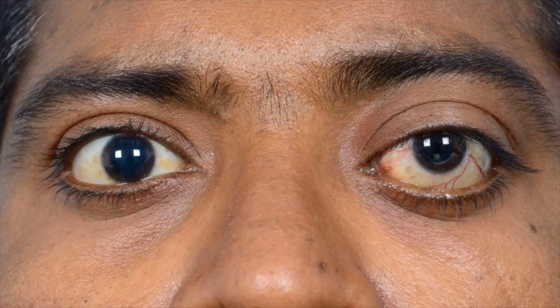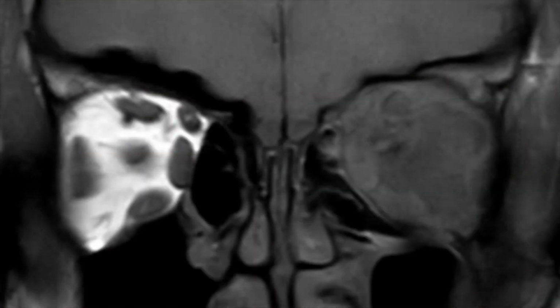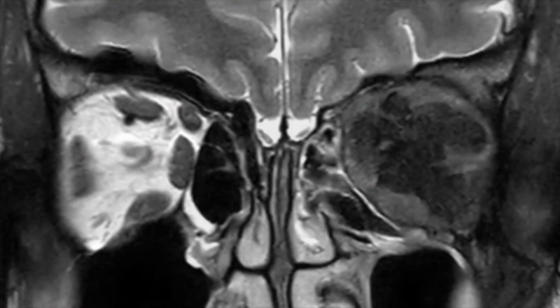Here is a 34-year-old male with only light perception in the left eye, axial proptosis, restriction of ocular movements in all gazes, retrobulbar resistance, palpable firm tender mass inferomedially and choroidal folds. MRI showed an ill-defined lesion, hypointense on T2 and iso to hypointense on T1 in the intraconal plane with focal extension into the extraconal plane along the superolateral and inferolateral aspects.